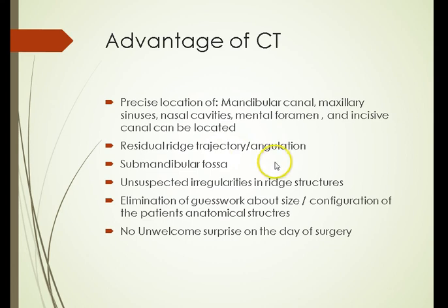You're not just seeing one side that's the highest, but also maybe let's say the buccal side is nice and up, but the resorption is on the lingual side. On the PA you can't tell, but in CT you'll be able to see that.